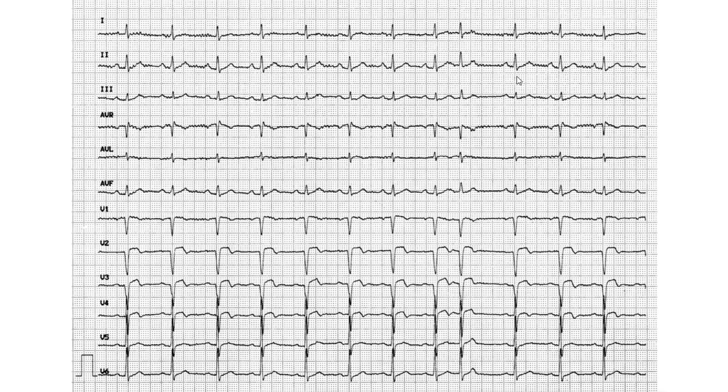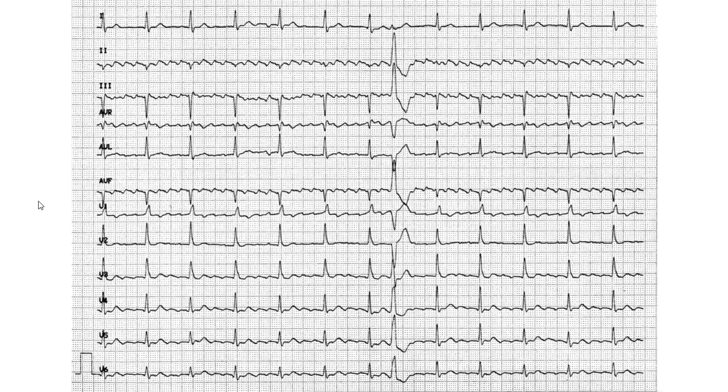The main thing I want to focus on is point 1 in the next 3 examples. I think that's enough. I just wanted to highlight in this ECG the idea of this being an extrasystole, and still it counts as regular, technically speaking. We might get back to it later. But yes, extrasystoles can hide. Next one. What is the pathology?